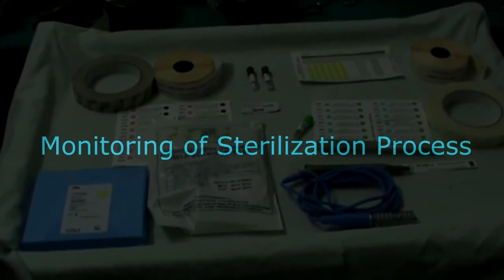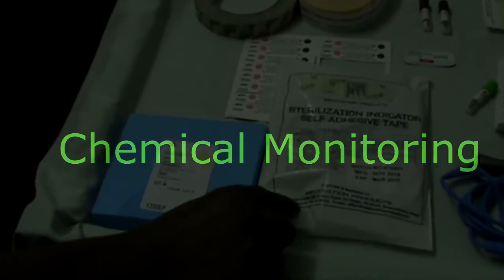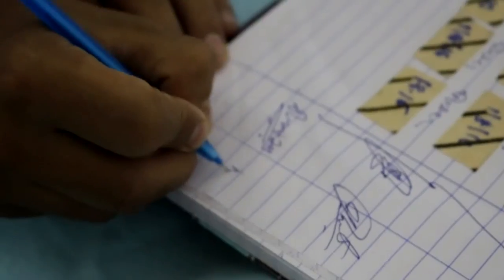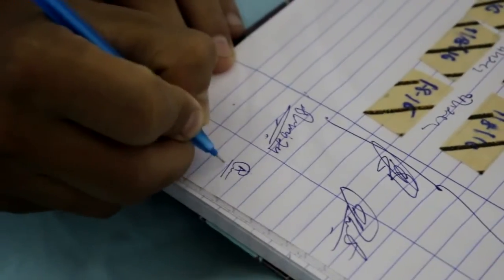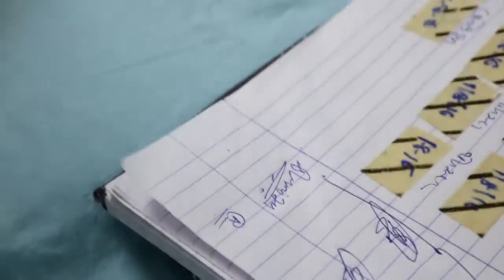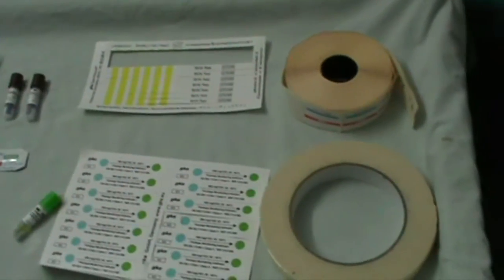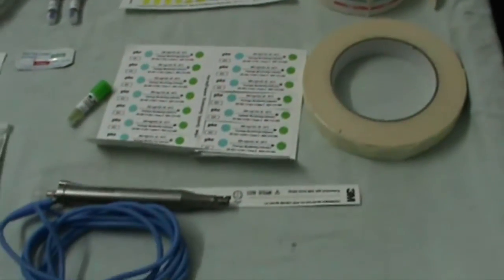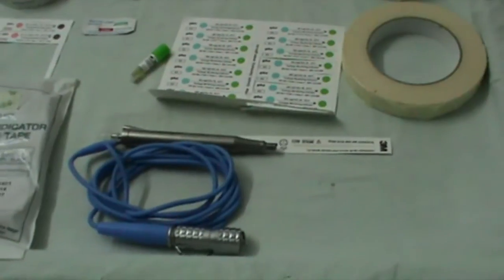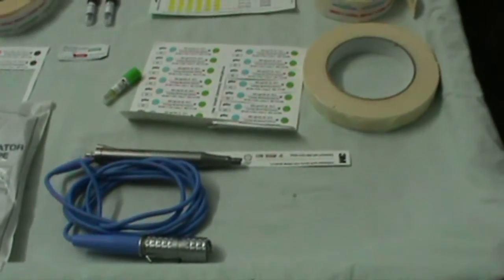Monitoring of sterilization process and the table of classes of indicators. Chemical monitoring. The autoclave strips should be checked for their color changing to jet black, and the autoclave strips register should be signed by the theatre in charge and the operating surgeon both after pasting the strips in the register. This is done before the surgical session starts. However, chemical indicator strips change their color based only on the temperature attained. It actually does not indicate sterilization.